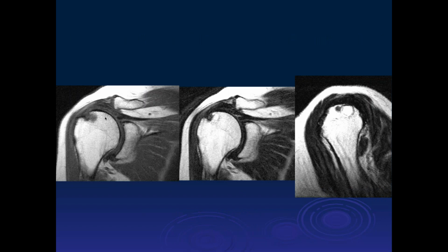Okay. Thomas, what do you think of this case? Oh, wait, let's see. I'm sorry, Sahar, what do you think of this case? Okay, so we have two coronal and one sagittal views of the shoulder, and there is like traction cystic changes in the humeral head at the attachment of the supraspinatus. I don't see any definite tear in the supra.